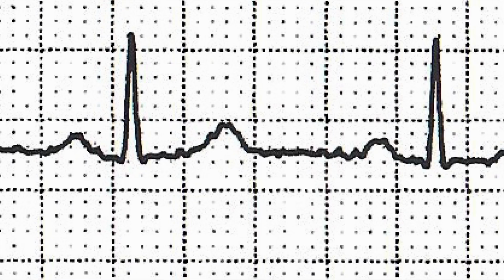So your T wave, just looking at this, you would say, okay, here's your isoelectric baseline. Your T wave probably ends right here, where it comes back to the baseline. No. Your T wave is measured by trying to find the sharpest slope.